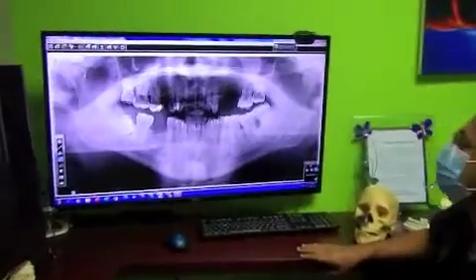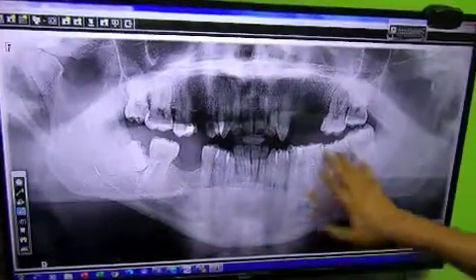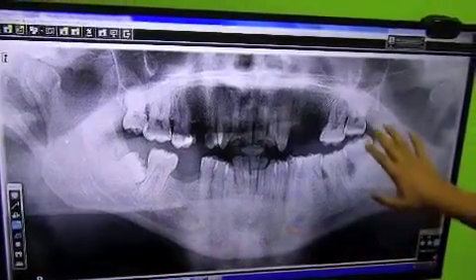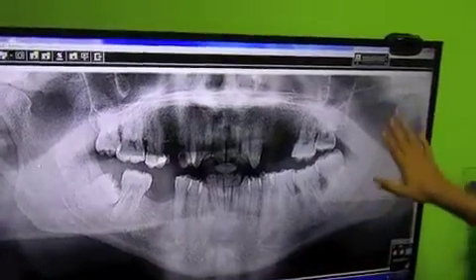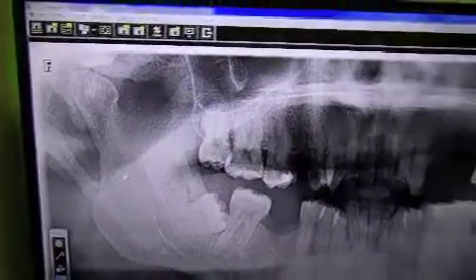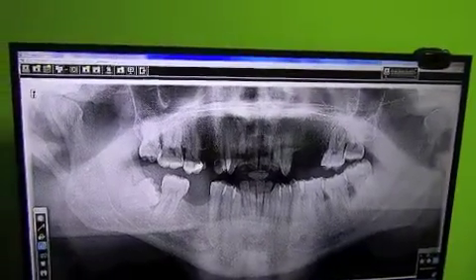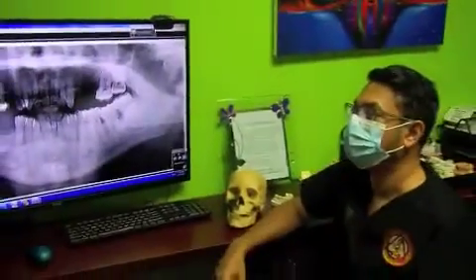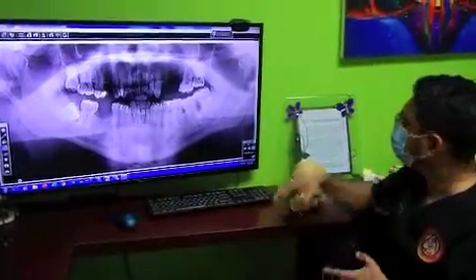So, just to give a little bit of context, we have a PAN here and we just pull one up. It's not the best to demonstrate what we want to talk about, but you can take an overview of this patient. Obviously missing some teeth, impacted wisdom teeth, possibly some cavities, bone loss and so on. But really, you look at the TMJ joints, and a few things are clear straight off the bat. There's an asymmetry in the joints, the left and the right side. And I'll go out on a limb to say that this patient would have some deviation of the mandible on opening and closing.